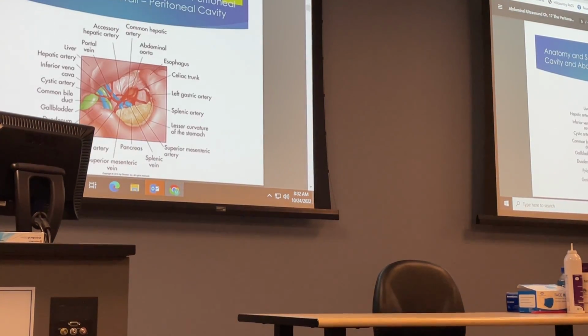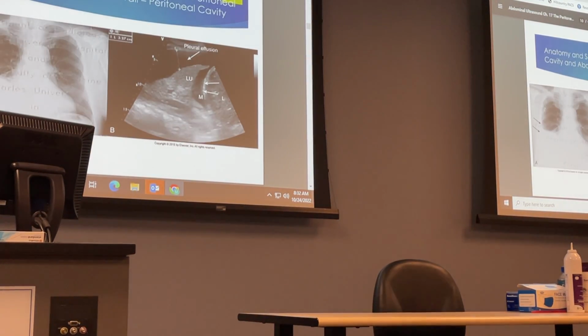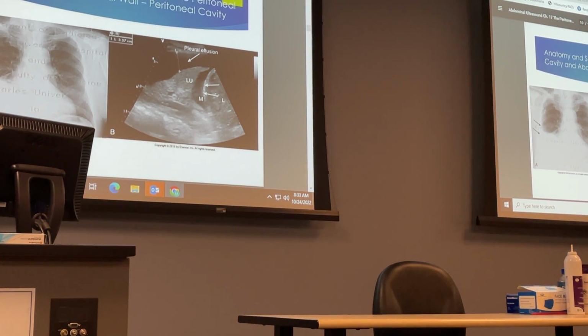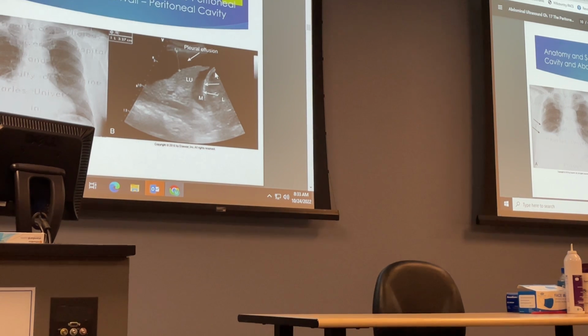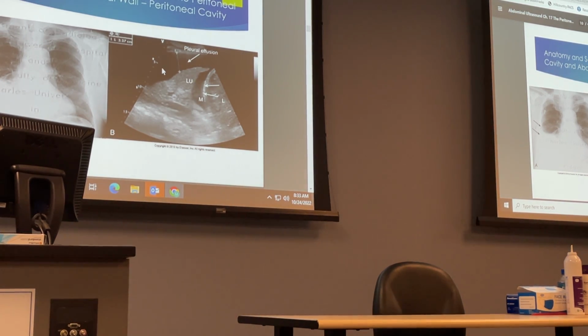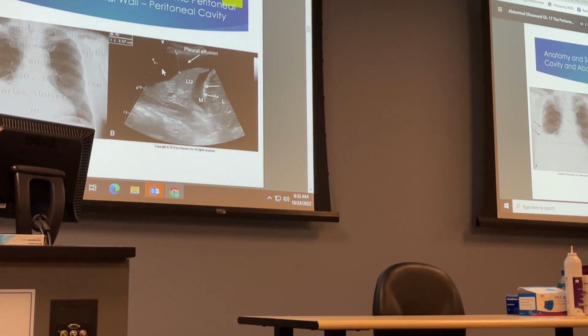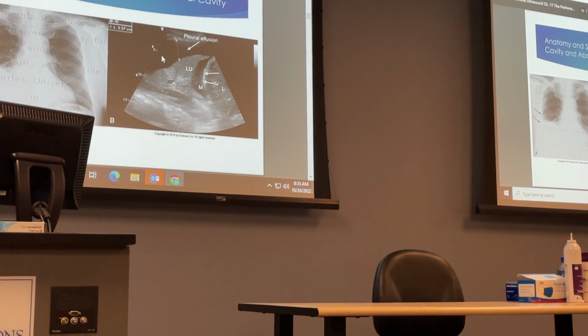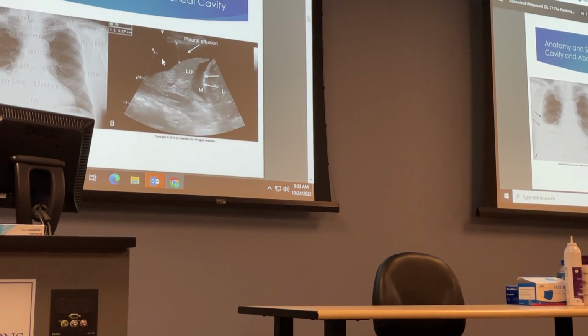Okay, in this chapter, one of the biggest things, obviously, you should be able to identify is pleural effusion versus ascites, etc. So here you can clearly see, here is the diaphragm. So this is liver right here, meaning this is lung tissue, and all of this would make it pleural effusion versus ascites, right? It's clearly around the lungs. It's above the diaphragm, so that is pleural effusion. Everybody okay with that?